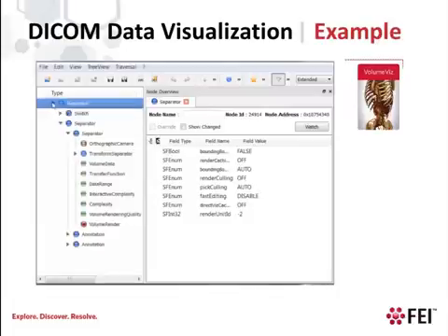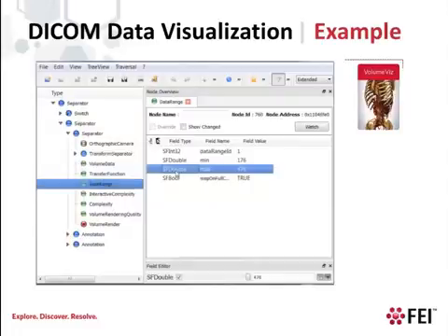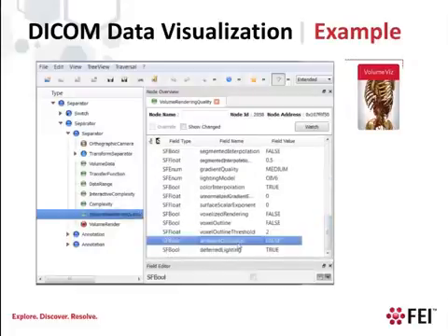When we expand the tree, you can see the structure of the scene graph is still quite simple even for this quality rendering. Here's our camera, the data node, the transfer function, the data range, the rendering options, and the actual volume rendering node. By showing you the structure of the scene graph, IV-Tune can help you debug your application. If we click on one of the nodes, for example the data range, IV-Tune will display the fields of that node and allow us to interactively modify them. This makes it easy to experiment with the many rendering options.